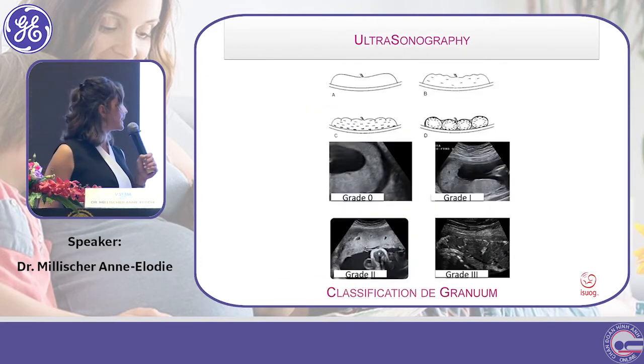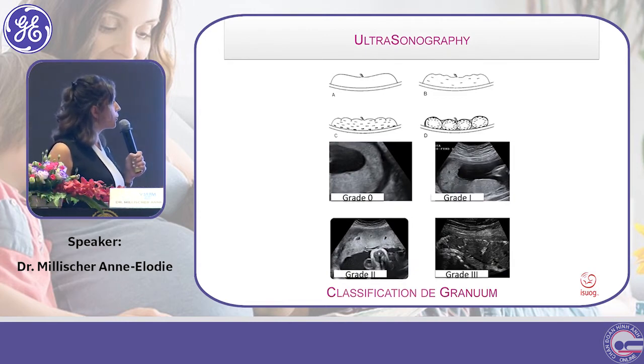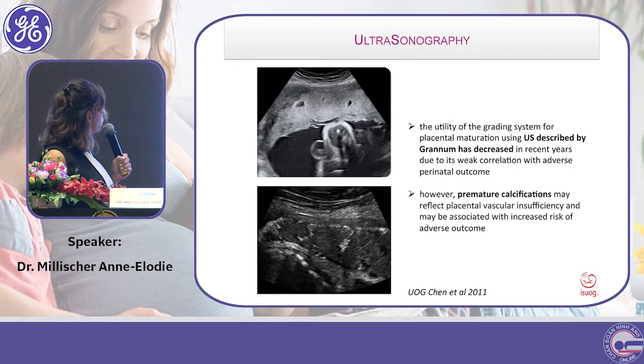The Grannum classification is done daily, but it's not very reliable to predict a dysfunction of the placenta.